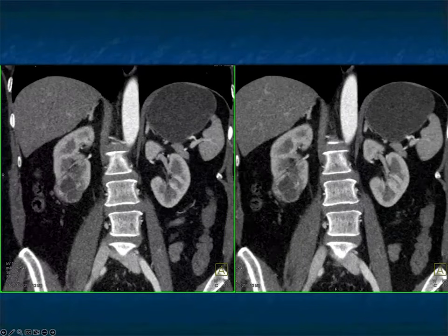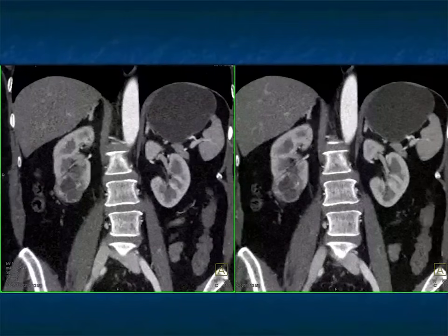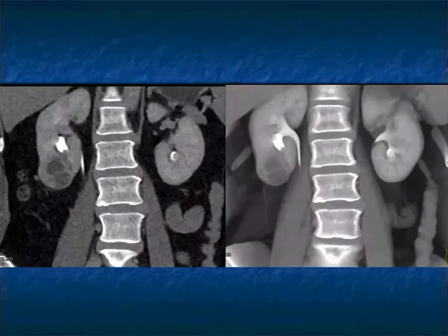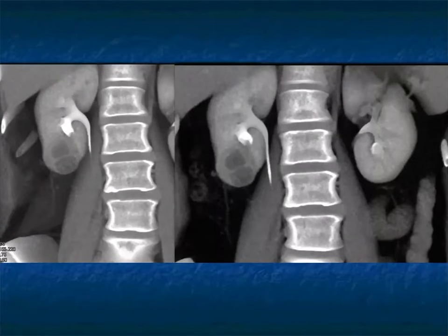Now, if I told you this was a cystic renal cell carcinoma, you would surely agree with me. If I told you the patient had fever, you may be saying, well, could this be an abscess? Renal abscesses and cysts or infected cysts and cystic tumors can look very similar, and it can be really challenging. Here's the lesion on excretory phase imaging, and again, clinical history. Positive urine culture would push you obviously to infection, but you have to admit I've shown many cases of cystic renal cell carcinoma. Again, look at the age. As a 25-year-old rather than an 85-year-old, it's more likely infection.